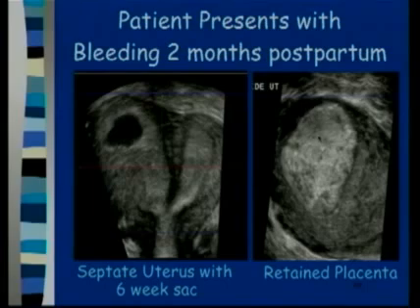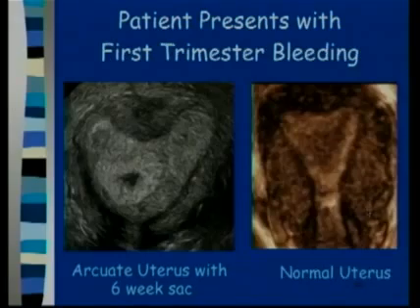And when she came in, I knew immediately that we needed a C-plane through her uterus to see the other picture and see whether there was anything in it. And retained placentas are very common in patients with septate uteruses. This patient actually had a manual exploration to get the placenta out at her delivery at 32 weeks, but still she ended up with retained placenta.